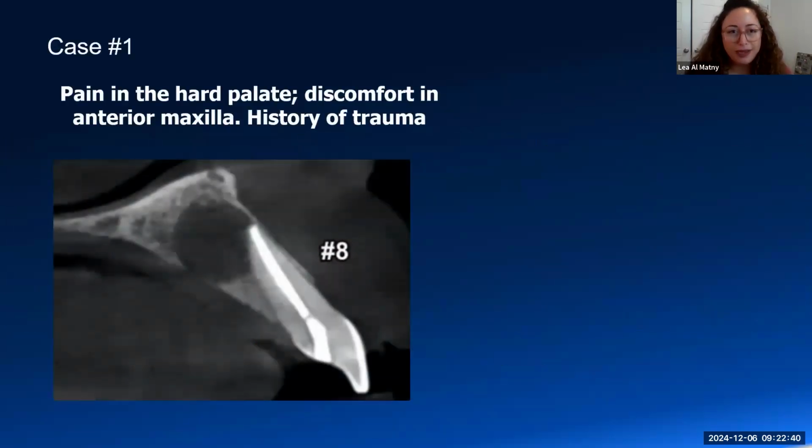Because of that, I'm going to go through, I think, 2 or 3 cases that show the benefits of CBCT simply when it comes to diagnosis and guidance in treatment plan, regardless of the actual treatment. So whether it's implants, endo, the purpose is diagnosis. I think that case 2 and case 3 are also more focused on the variations of anatomy that we can see within the jaw and can impact your treatment.